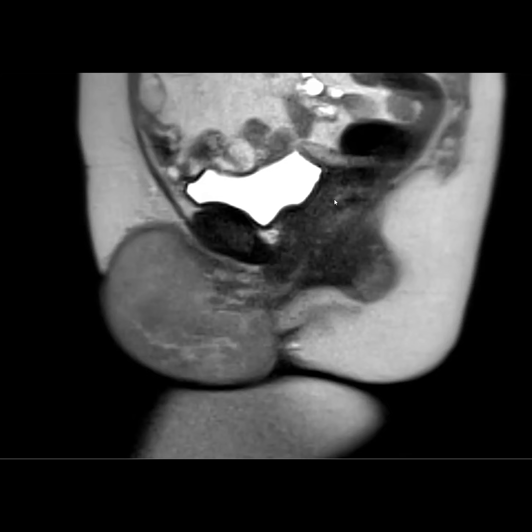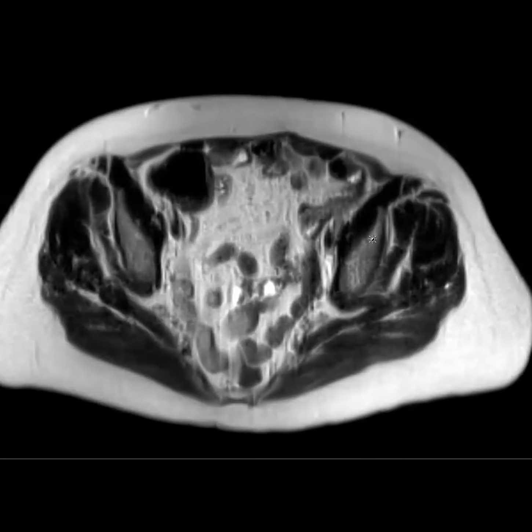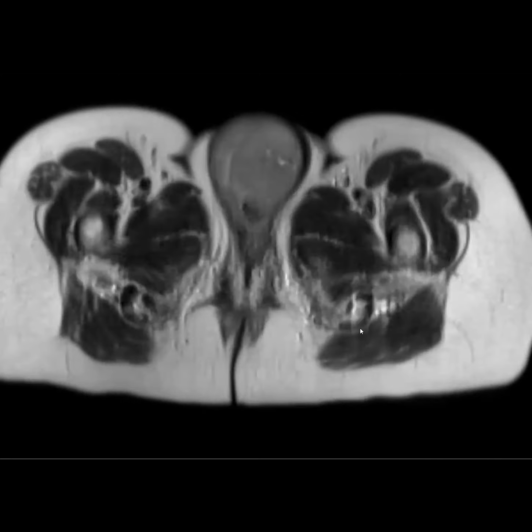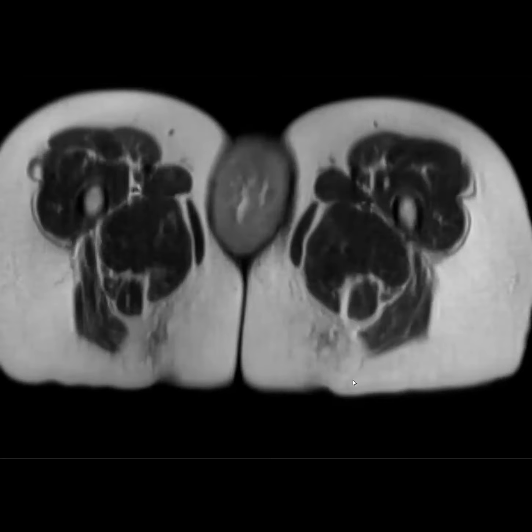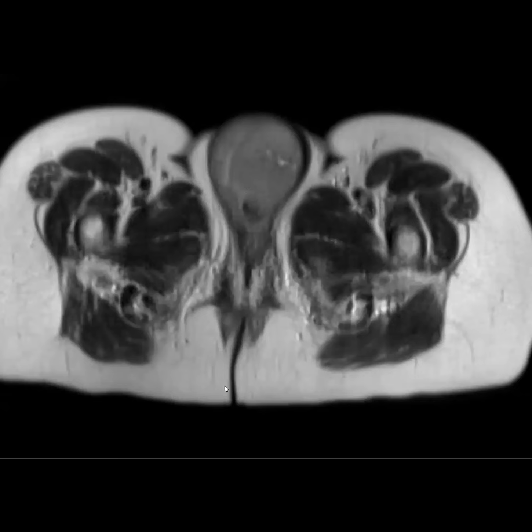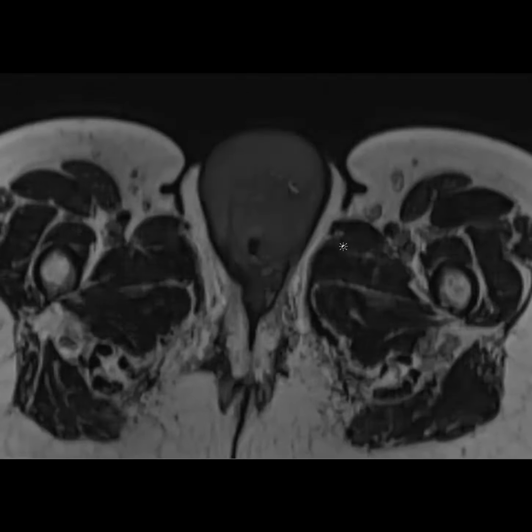So we've got the urethra here. I don't think we see the vagina super well, but it's kind of back here. So it could be arising from the distal vagina or even the labia and the rectum. Vulva, yeah. So we were wondering, is it arising from the distal urethra, et cetera? Here it is on the axials. And on physical exam, they told us this looked like a clitoral mass. So here's the urethra, and it looked like it was arising externally, anterior to the urethra, from the clitoris. So here it is again on the high resolution.